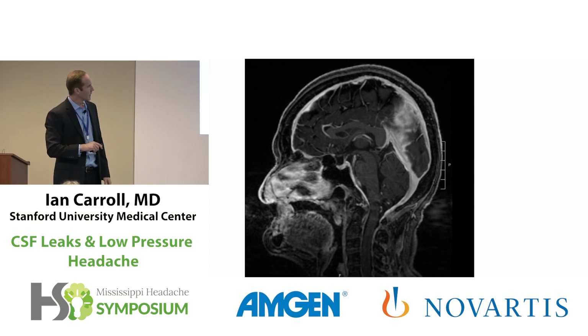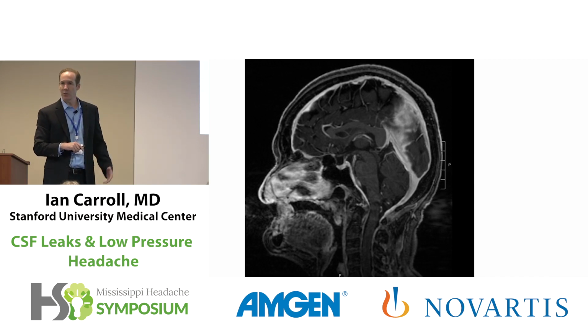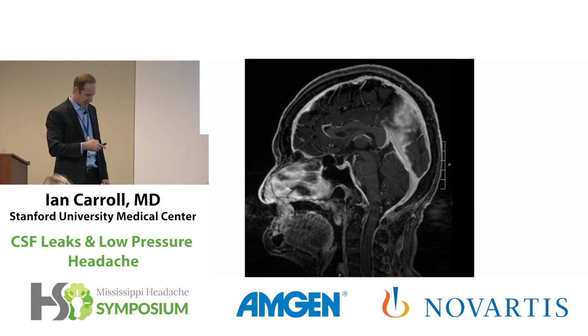This is a structural alteration that comes along with what's called brain sag. It's a little hard to see in this scan whether the cerebellar tonsils have made it beneath the foramen magnum or not, but how the pons is bent up here is a sign of sag a little bit.